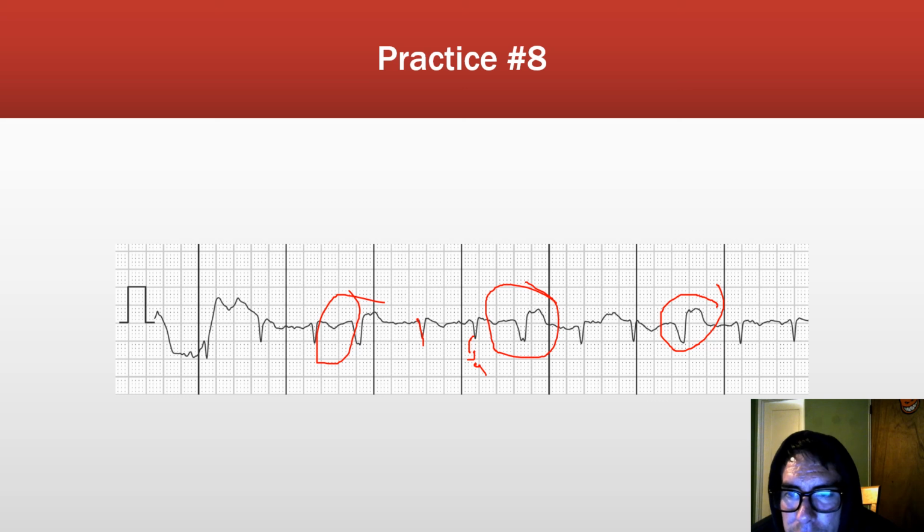it's kind of hard to determine if there's P waves. I think I see some, but it's not very clear. So let's see here, and it's hard to tell if it's regular or not just because of the ectopic beats. But in the places like from here to here and there to there, that looks fairly normal, but it's hard to tell.